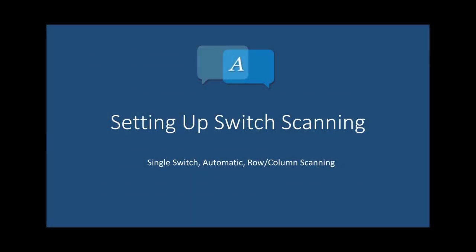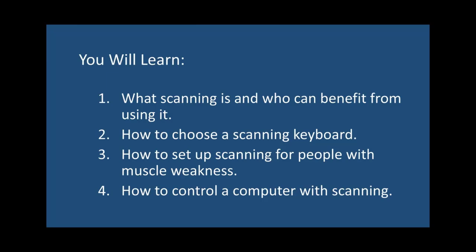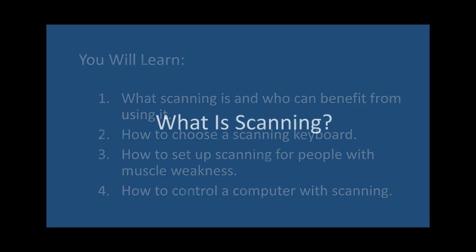Hi, I'm Amy Roman. In this video, I'll guide you through setting up switch scanning in AlphaCore. We will look at what scanning is and who can benefit from it, two keyboards in AlphaCore that work well for scanning, and how to set up scanning options that are tailored for individuals with muscle weakness. We will also look at how to control your computer and navigate the web with scanning.